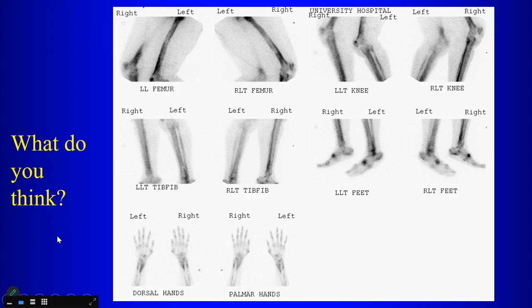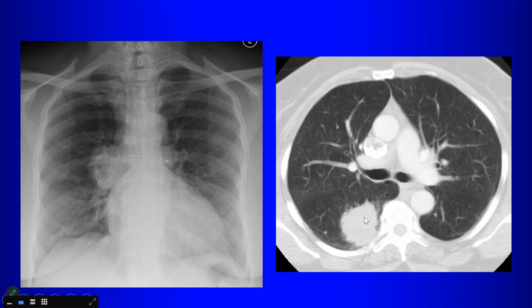And the only reason somebody might show you a bone scan in a lecture on lung cancer is, well, one reason might be bone mets, but are these bone mets or is this something else? Maybe the pulmonary osteo. Yeah. So pulmonary osteoarthropathy, right? So you have these areas, the cortices here, there's increased activity here in the cortices of the long bones. Lung cancer can be a cause of that, a pulmonary osteoarthropathy. Okay, so that can be associated with lung cancer.